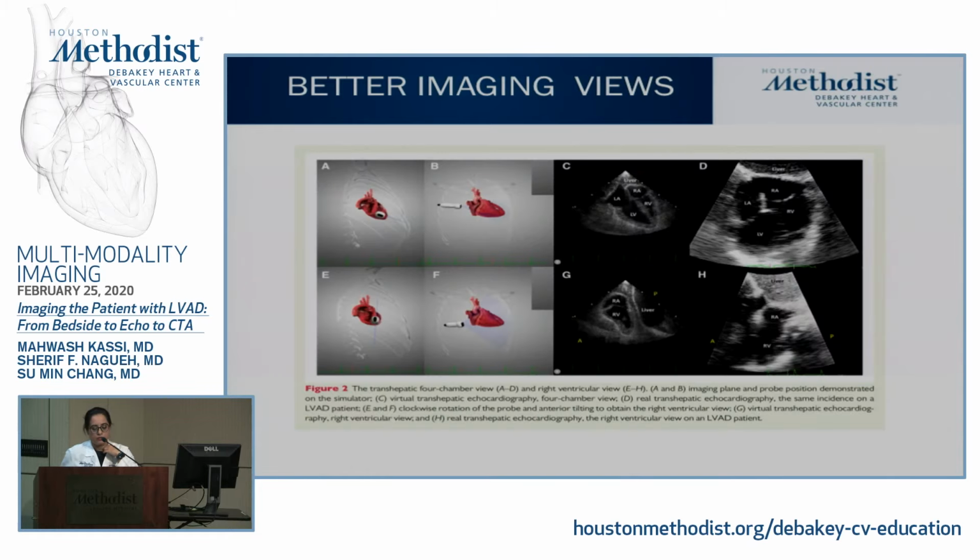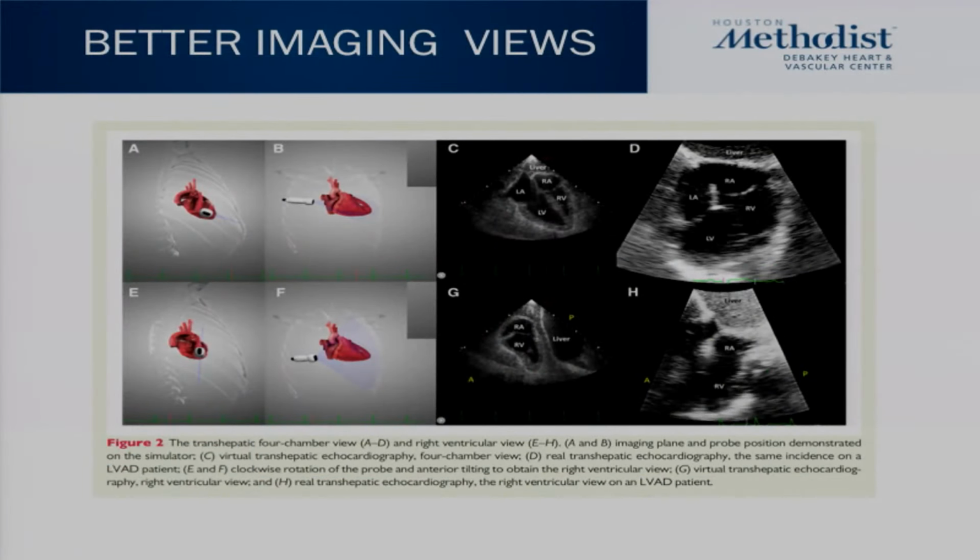This is what real-life images look like. They compared a dummy image versus real-life patient images, and to be honest, that's really what we need. Even though these images are not the greatest, even in this example, I still think we get all the relevant information that we need from this view.